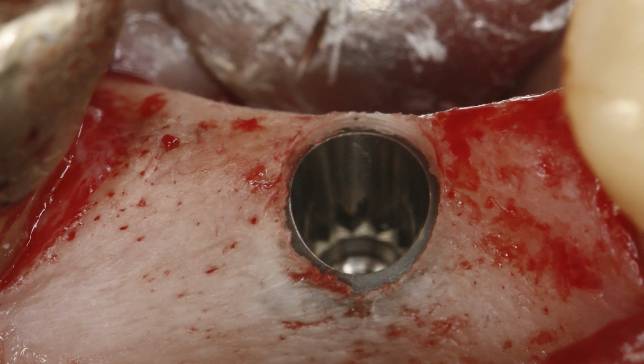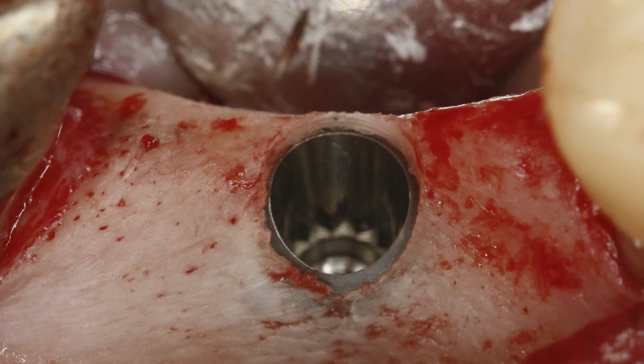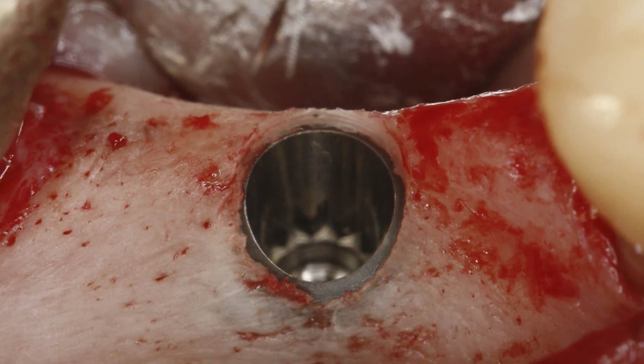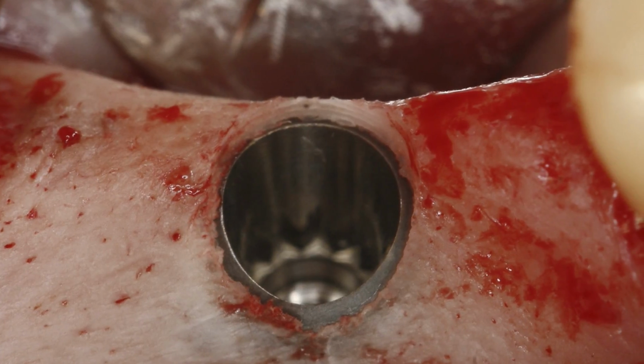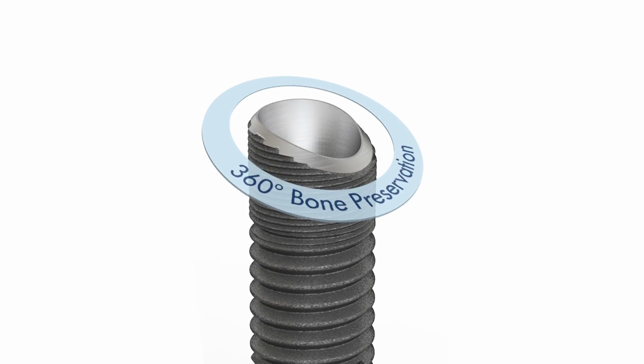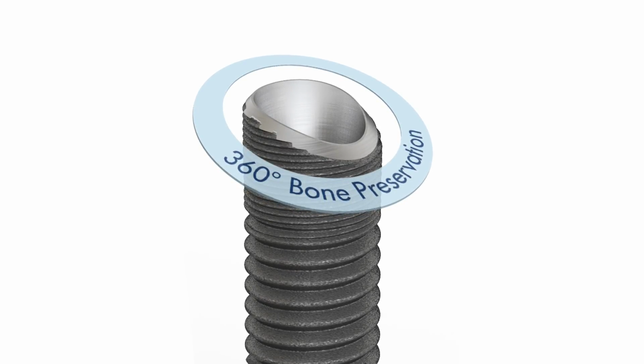By placing an implant with a sloped neck, both buccal and lingual bone is preserved, which in turn supports mesial and distal marginal bone. In other words, bone levels are maintained all around the implant. We call this 360-degree bone preservation. In addition, the need for bone grafting can be reduced.